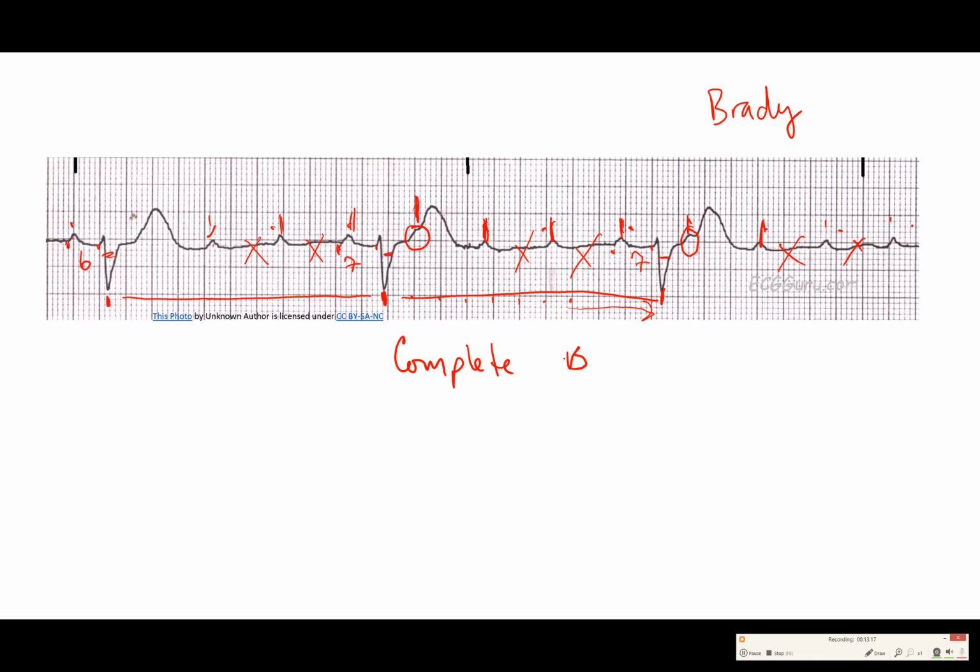So this patient, if you saw this, you'd want to get them on a temporary pacemaker and then get them to the cardiologist as soon as possible in order to get a pacemaker put in. This patient's not going to survive with this kind of heart block. So this is complete heart block.